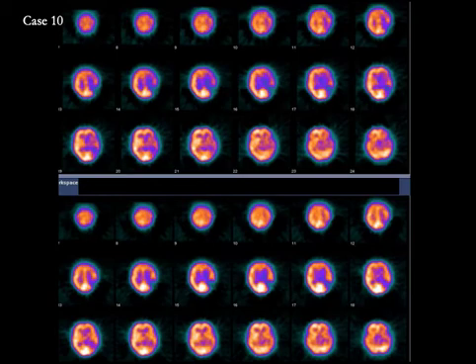Another patient with a similar history, two studies performed with and without Diamox. They do have a history of prior infarct, and we see a fixed defect here on the left cortex consistent with the prior infarct. But the MCA territory anterior to the infarct shows a perfusion defect which is reversible. So this is again evidence of compromised cerebrovascular reserve seen with Diamox.